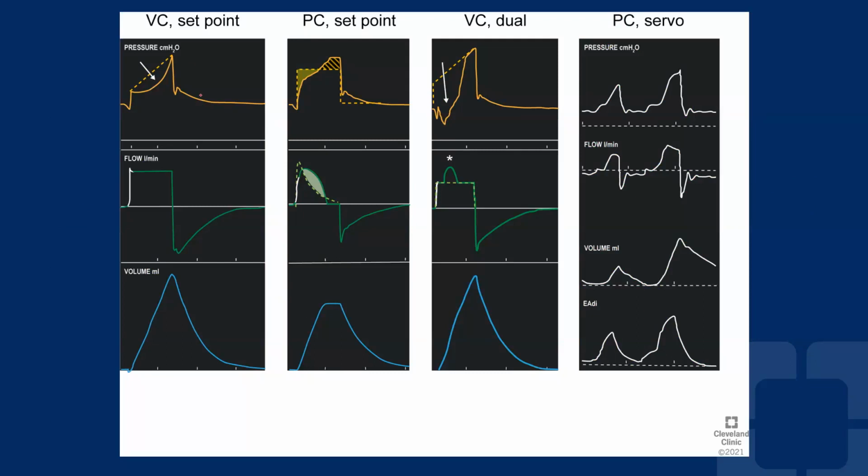But you see one breath that is this size and the other one is longer than the other one. You see evidence that this was triggered by the patient, because you see that drop in the inspiratory pressure before the breath, the same on this one. However, on the same breath, the question is what happened between A and B?